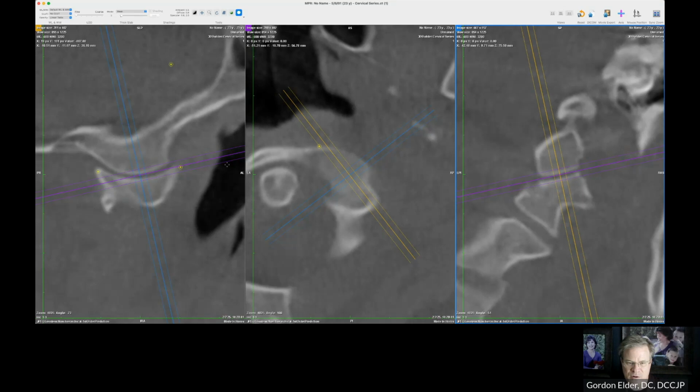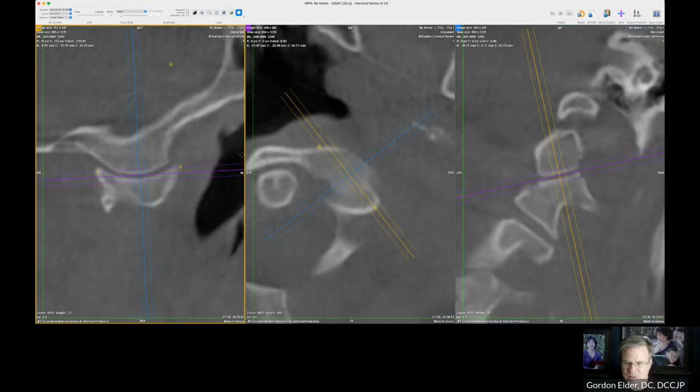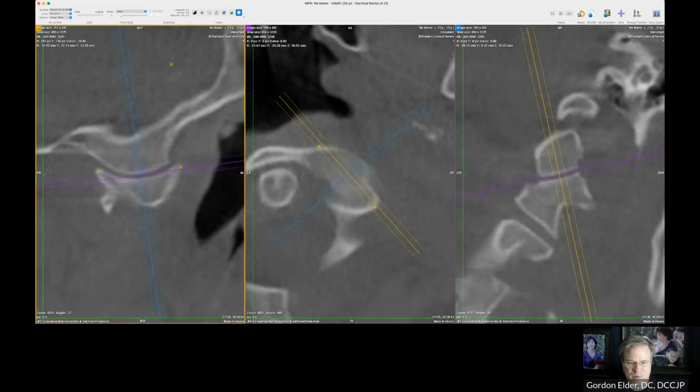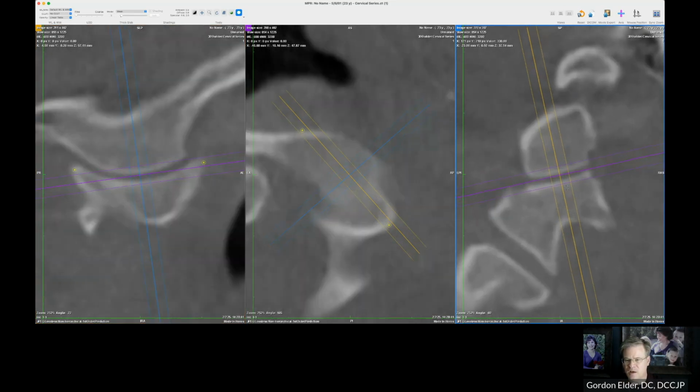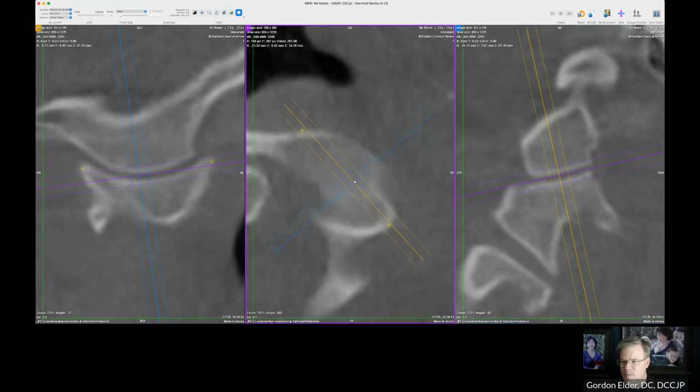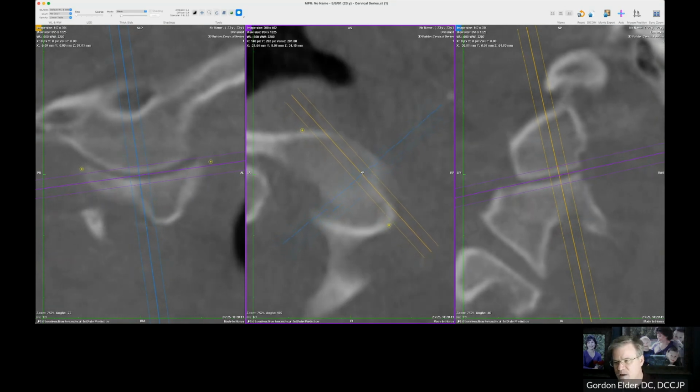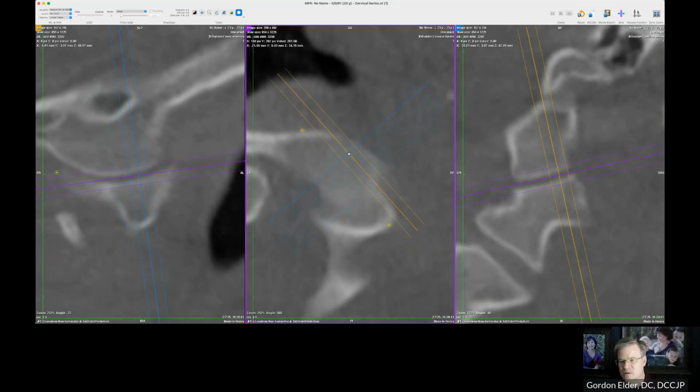I can't see my other angle. So let's go ahead and do this. Make sure I've got the right convergence angle. Now I'm going to make sure that I'm tangential to whatever point there. I'm going to call that even. We start looking too close, and the gnat's eyebrow is probably just going to lead to confusion. As I start moving backwards, I'm seeing a little more posterior, or not posteriority, but underlap.